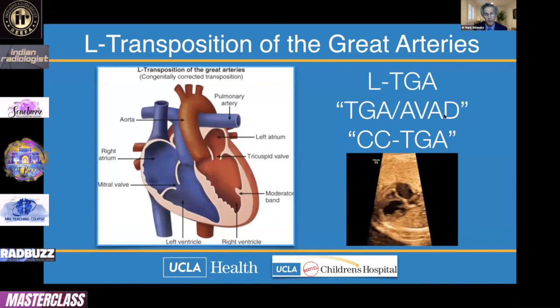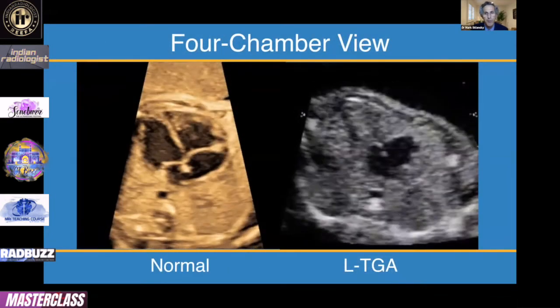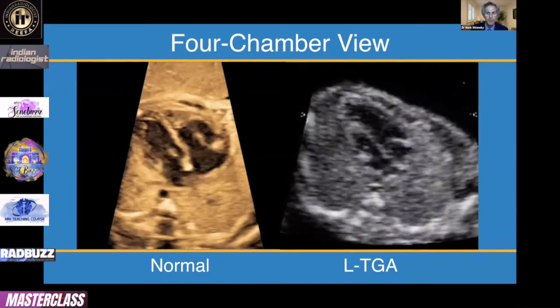This is a case where the terminology is not the best. But that's the way I think about LTGA, or congenitally corrected transposition. This also is generally not associated with genetic abnormalities or extracardiac abnormalities, but it's typically associated with other cardiac abnormalities.